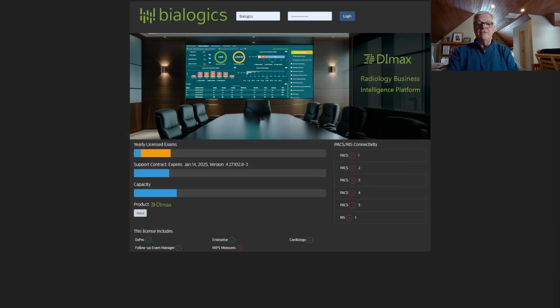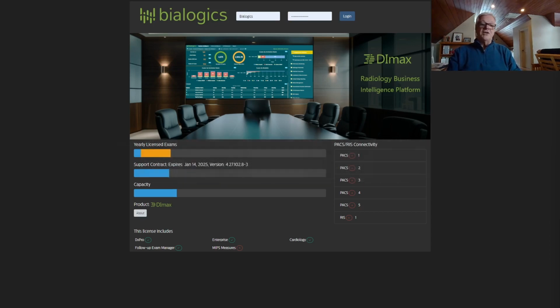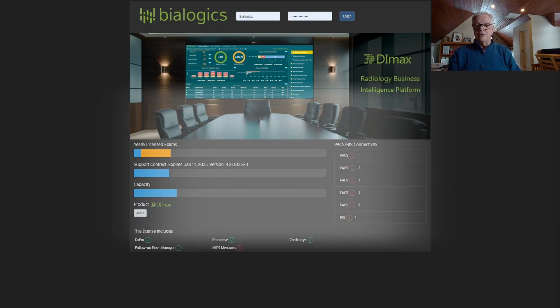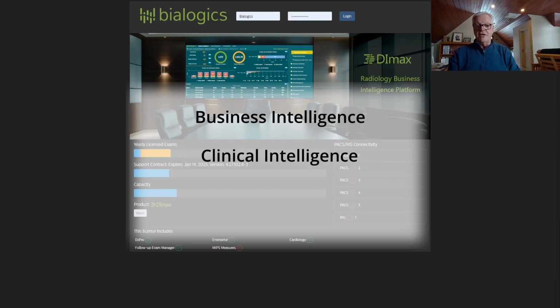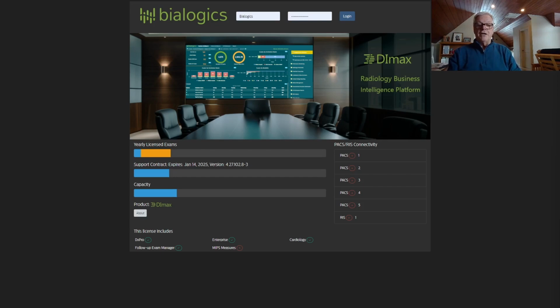This allows us a unique advantage to create cross-functional data analysis for operational performance and productivity analysis, as well as clinical report analysis for quality assurance, research, and AI cohort development purposes. Our system is based on three separate modules: business intelligence, clinical intelligence, and AI performance monitoring. Allow me to introduce you to the Bialogics DImax radiology business intelligence platform by walking you through these three modules briefly.